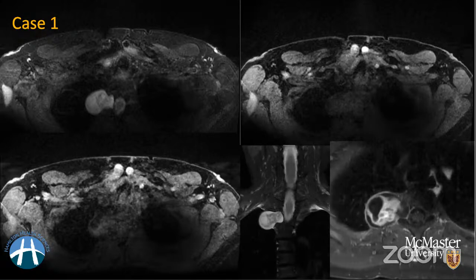All right, thanks, Amar. Those are really good differentials and really good points that you pointed out. So, moving back to the first question, the first diagnosis here is schwannoma, which indeed it turned out to be. There are a few pointers for a schwannoma in this case. If anyone knows, this particular appearance on T2-weighted imaging has a name to it. It's a sign, and the sign here is called the target sign.